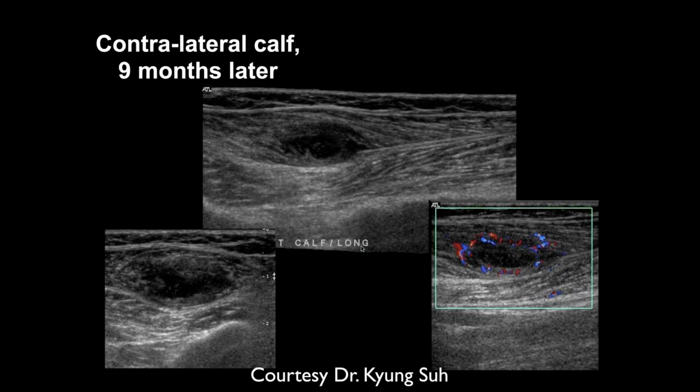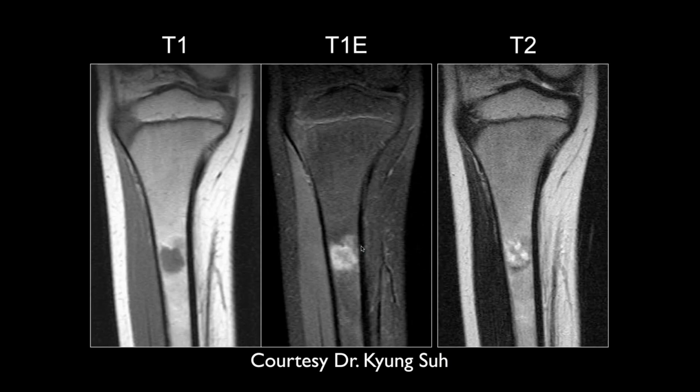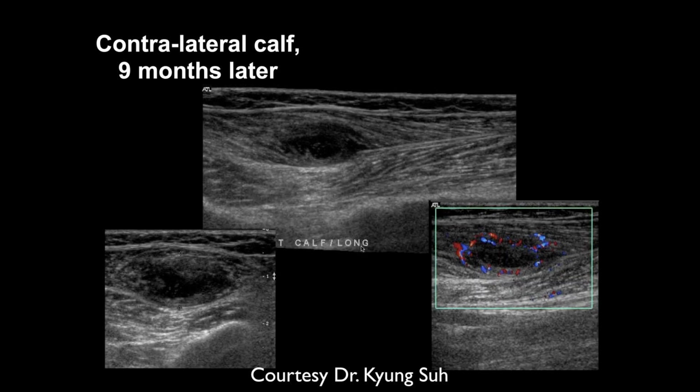Can we rule out involvement of his known AML? Well, I don't think you'd see AML as a mass within the muscle like that, and it's usually not this focal in the bones. So you have to be concerned, and they can get infected by unusual organisms. A lot of these have to be worked up. Obviously, this was biopsied, and they grew out aspergillosis. That's how they made the diagnosis.